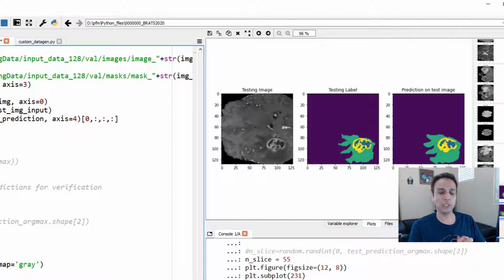I tried Tiramisu, which is so freaking slow. Tell me if I'm wrong. Okay, tell me if I'm wrong. Give me a network and then challenge me to use that to segment any of these if it's faster. But based on my limited experience of these other networks, I don't even go there anymore. I just use UNet. I'll change the UNet encoder from standard encoder to VGG or something else, but then the structure, the architecture, still UNet is very amazing.